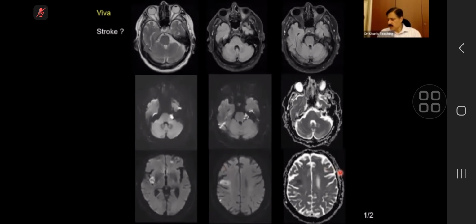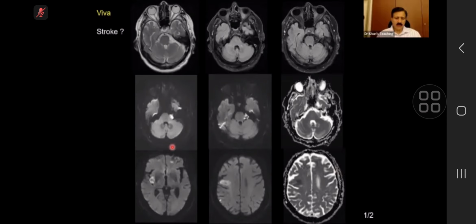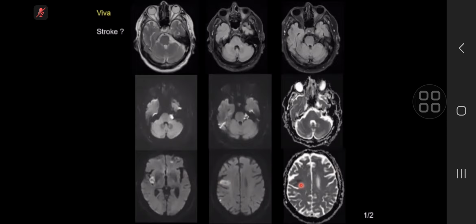Last 2 or 3 or 4 cases, just for pattern recognition, then we'll stop. Yes, please. Okay, on the... Is there an acute infarction? There is restriction diffusion, so... So clinically, we were worried about infarction. So there is restricted diffusion, right? Yes. What else is happening?